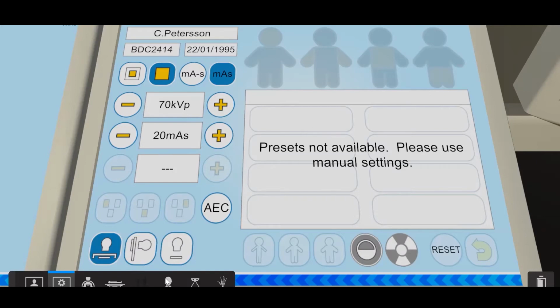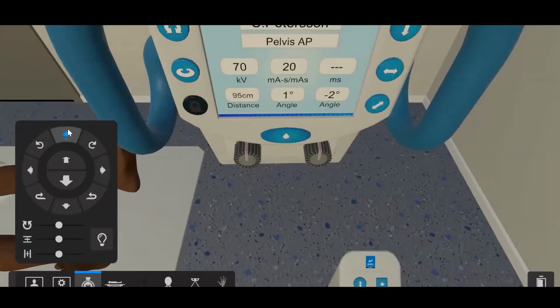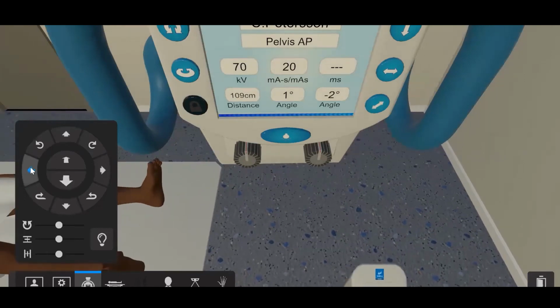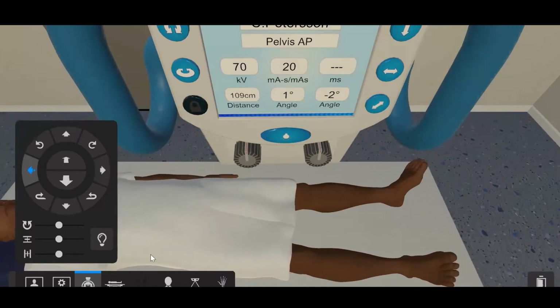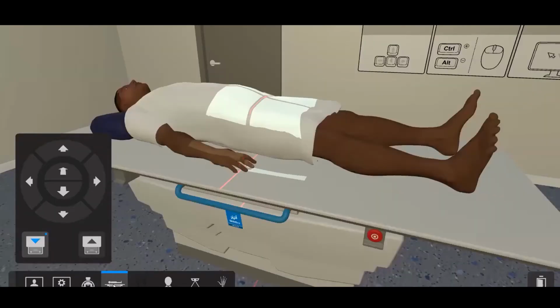Right, so broad focal spot, I'm happy with that. And if I take that up to 110, that'll do. I'm not in the clinical department at the moment. And we'll go over and we'll put this roughly in the right position. This user interface might look slightly different to yours. I'm on the latest build, which has a couple of different extra features, such as moving the light box. And you'll see in a couple of minutes the collimation square, but they will be released very, very soon.